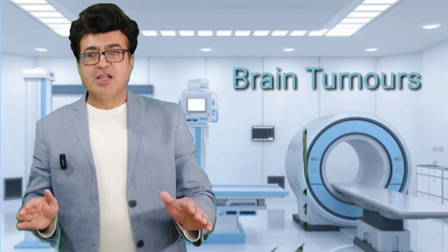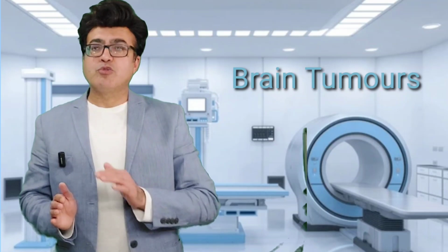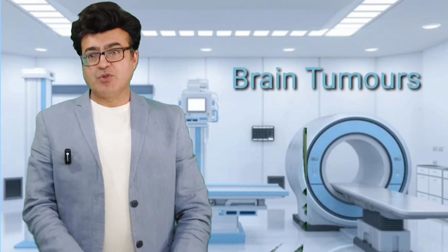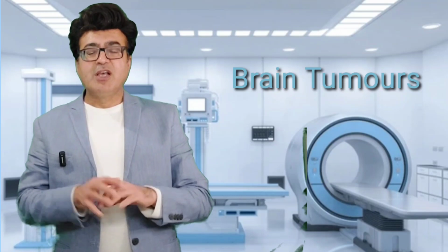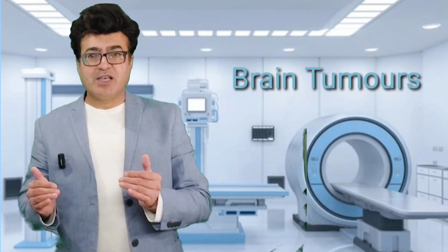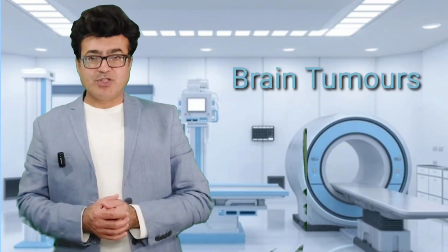So all these points are included in this video. Just have a look and make a first layer of knowledge, and on the basis of that we will start discussing one by one. Like we'll discuss astrocytoma, ependymoma and oligodendroglioma, but step by step. This video would be a first layer of knowledge. Just get an idea about intraaxial tumor and extraaxial tumor, and then we will discuss ahead.